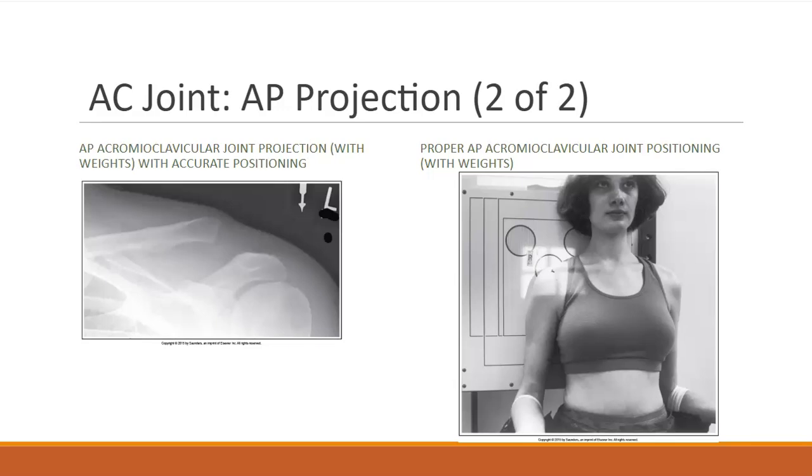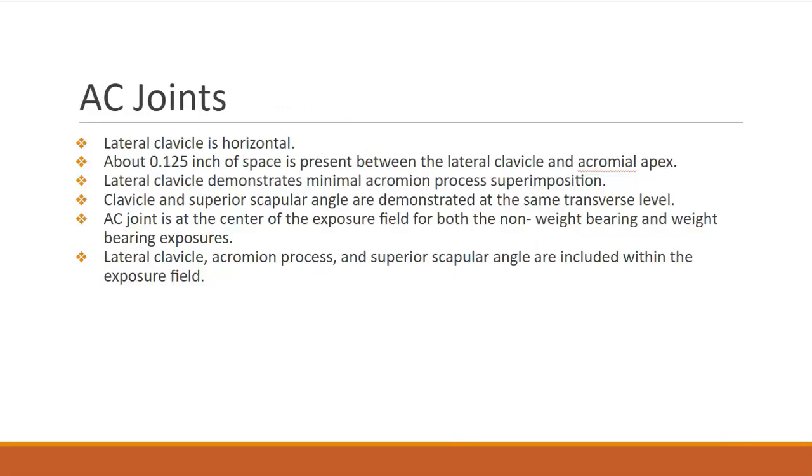This is an example of with weights. You should always put an identification marker labeling with weights and which projections were with weights and without weights. Here are those image analysis guidelines for your review.